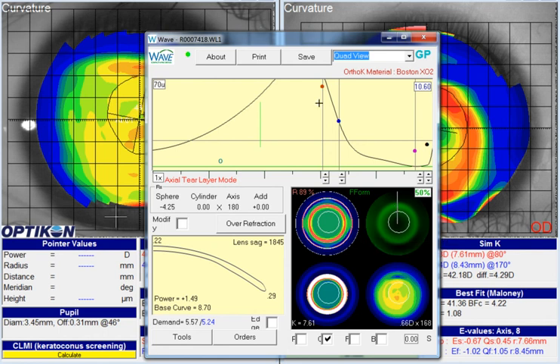If we wanted to get rid of it, we could just reduce the OZ and IC and then adjust the power. That would make the graph a little bit shorter. And I think the closer we get to 70 microns maximum clearance, the less likely we'll get bubbles. But again, I don't know if that's really an issue. I think if we can get this lens to sit a little bit higher and reduce how much cylinder is being molded into the cornea, that bubble probably won't be a big problem for the patient.